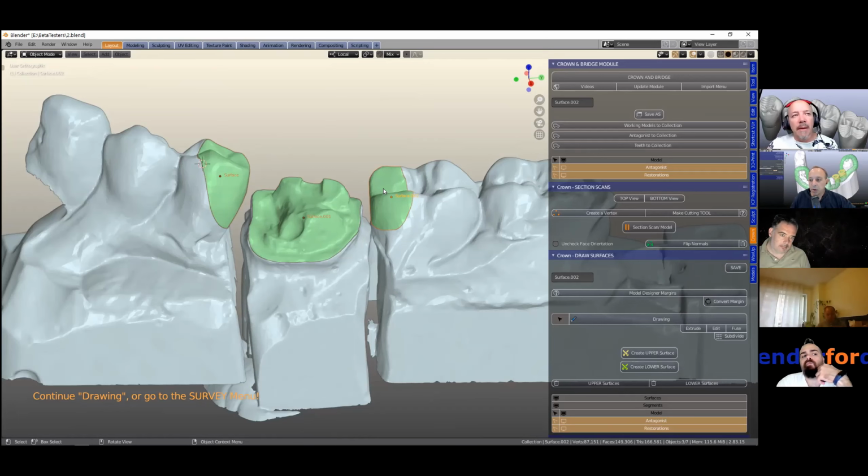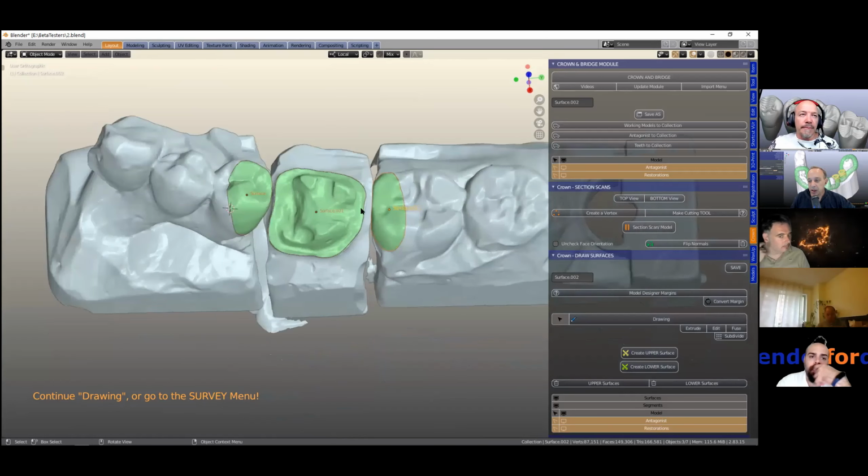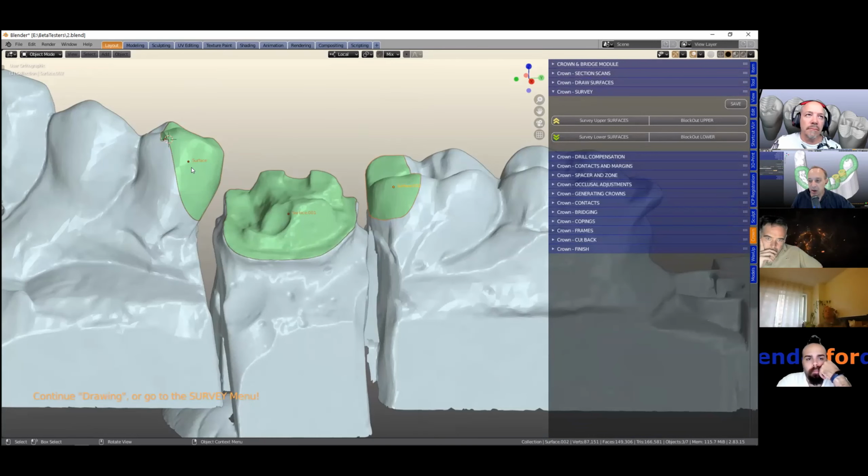That's right, because the contact determines the path of insertion, and even in the lab, we sit there with the carbon paper and we grind. It's a very tedious job getting these contacts right. So it's good that it's following the path of insertion that you choose.